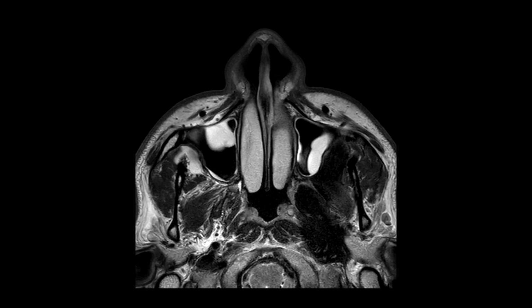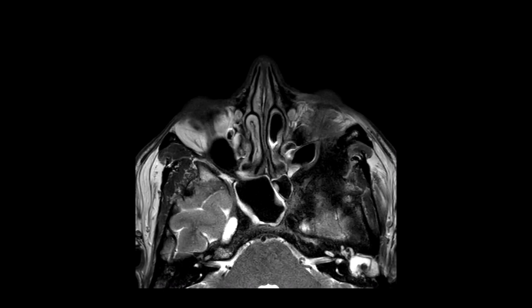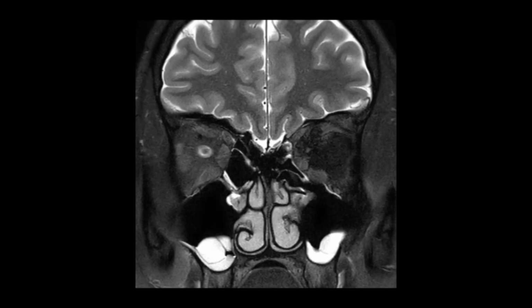Similar T2 hypointense lesion involving the dura was seen extending into the left cavernous sinus and floor of the left middle cranial fossa. He was diagnosed to have idiopathic orbital inflammation, that is, IgG4 related disease, and responded well on being treated with IV methylprednisolone. A 26-year-old male presented with right upper eyelid swelling following trauma, axial proptosis, diplopia, a firm non-tender mobile mass in the superomedial region, and retrobulbar resistance.